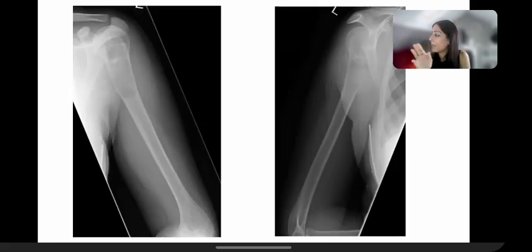However, the patient kept having pain. Pain settled, but she had a history of paresthesia and she presented again, in December 2015. As we said, we do not discharge these patients if they have pain or symptoms that are recurrent or not responding, we call them back. So she presented again in December 2015. And as you can see now, that lesion looks healed. There is consolidation of the lesion. Again, there was no cortical breach, there was no periosteal reaction, and once again, it looked quite quiescent. It looked like a lesion that's just sitting there.